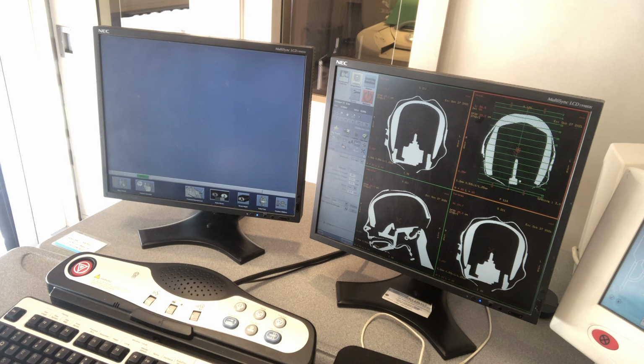So now we got to work on our sagittals. You're going to change the name here. Now it keeps our 3.0s here. But now we got to turn this box. So you're turning with the middle red dot. Just spin it around.